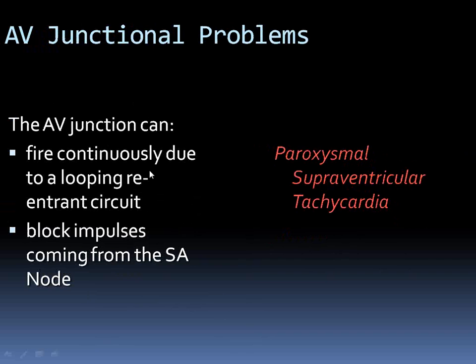Now this is a tachycardia, an example of which we saw, remember, in which the QRS rate was 75 and all of a sudden it jumped up to 150. Most of those arrhythmias will be originating in the AV node or the AV junction. Okay? Now what you have to remember is that whenever you see a narrow complex tachycardia in which the QRS is narrow and you see no P waves, always label it as a supraventricular tachycardia. It is an SVT unless proven otherwise.